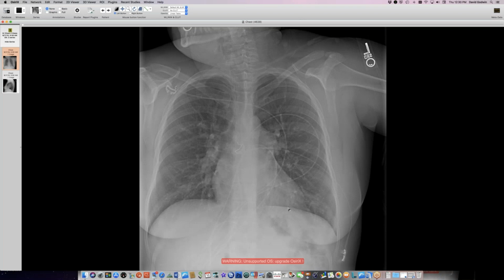Is there potentially something we might be able to see? Because I'm wondering whether the pulmonary arteries are distended. I'm looking at the main PA, left and right PA. I'm looking at a couple of pulmonary arteries on end. Right. I'm trying to decide whether pulmonary arteries are dilated. I don't know if I'm right about that. I don't think I see dilated pulmonary veins.